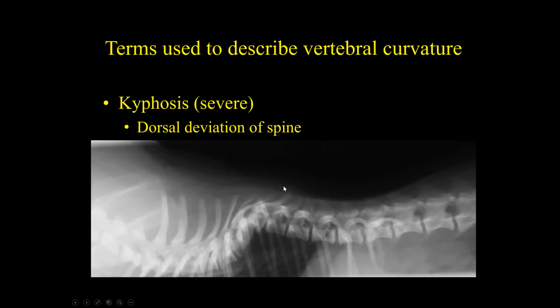Okay, so there it is. The opposite of that is a dorsal deviation of the spine, which is called kyphosis. A lot of times these animals that have kyphosis, it's due to hemivertebrae, like this guy here, which is a shortened, squatty vertebra. So chances are this is some type of Frenchie bulldog, pug, something like that. That looks pretty abnormal, and the deviation of the spine is very obvious, but most of the time this won't cause any clinical signs at all. They're just born like that.